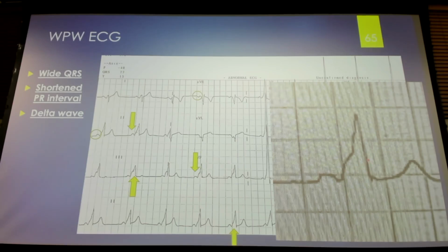Okay, this gentleman over here pointed one out earlier, but you won't see that straight up and straight down, what you expect. You definitely will see an indication that makes you ask, why is my R wave not going straight up and straight down? Why is it more convex or concave, or why is it squiggly? Okay, so here you can see that coming up. Even without me blowing this up, you can see there's something a little bit out of place with these R waves, that they're coming up at kind of an angle instead of straight up and straight down.